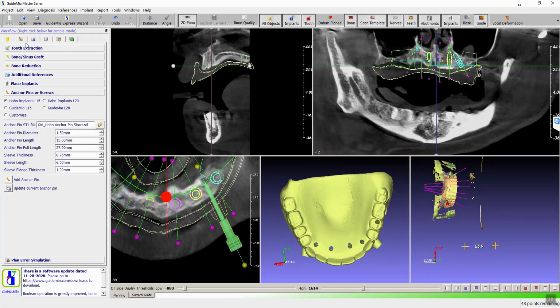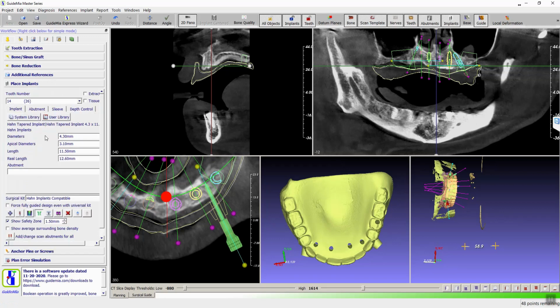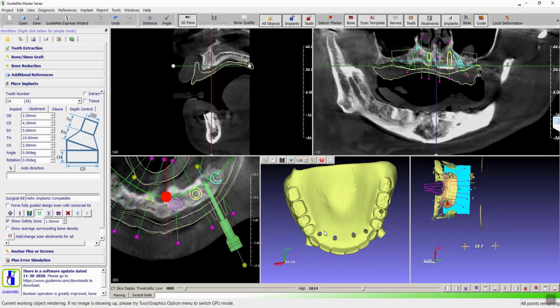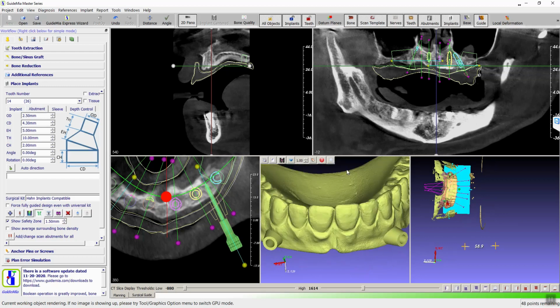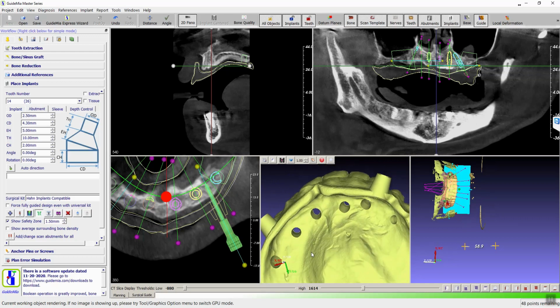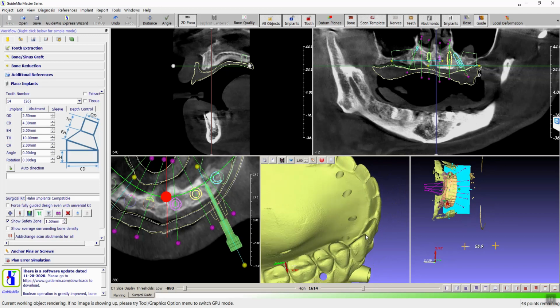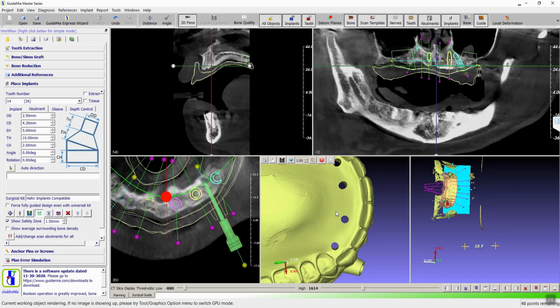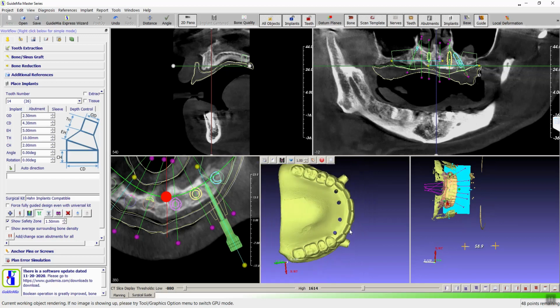So if you go to the placement area, go to the sleeve page, abutment page, the hole size is this OD. It's quite small, it's 2.5. So that's why you see small holes. We can make it bigger before we even get into this function. This is basically along the implant orientation and makes straight holes for the abutments. If we want to put multi-unit abutments, that's a little different to work on.